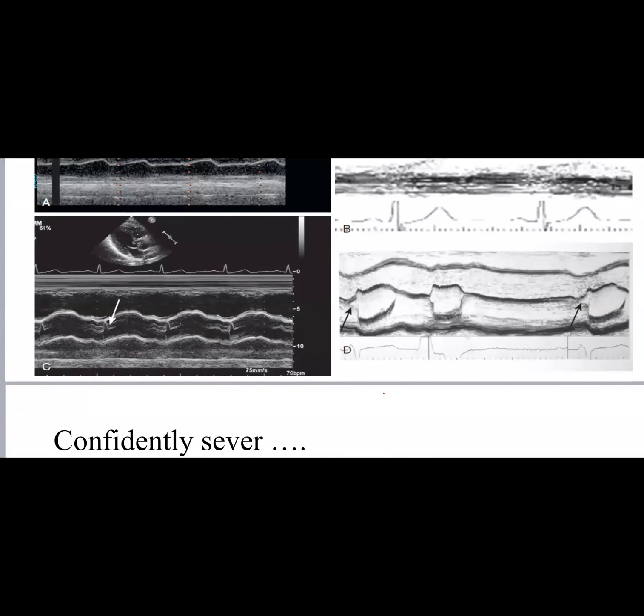There is a PVC in the middle, yes. If you check the one in the middle here, this is the PVC. This is after the PVC, after the pause. If you compare here, you see the opening here. It's sharp and it's right. It opens in systole, no problem. But this one starts to open in diastole. Okay. It starts to open in diastole because of the high LVEDP, added to that the high diastolic filling because of the compensatory pause. Okay, you get it now, Hanin? Okay, yeah, I did.